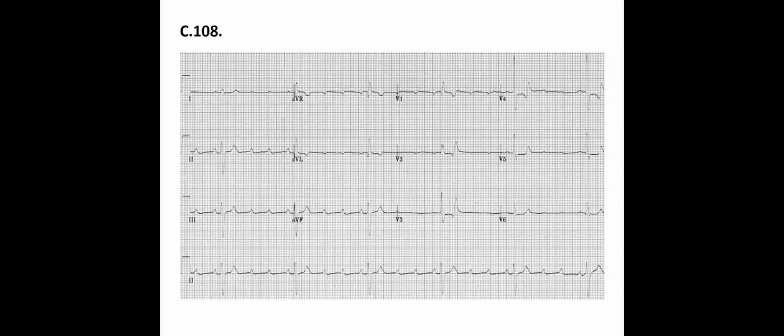That's very good. Yes. And I see another point. I have an abnormally longer QRS. A normal person has 0.1 second, but I see here 0.2 second. It's prolonged. I don't know whether I should highlight it or not, but that expresses some kind of heart failure. And no, you don't need to highlight that.